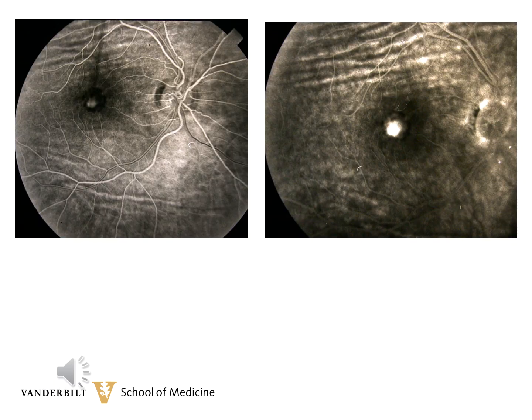This is a fluorescein angiogram of the last patient. The dark hypofluorescent lines are the troughs of the choroidal folds. This is where the pigment epithelial cells are bunched together and where the pigment consolidates. This consolidated pigment and denser pigment blocks the dye, and that is why it is dark. The ridges of the folds have stretched pigment epithelial cells, and they become atrophic, and they have lost some melanin. With less pigment, there is hyperfluorescence.